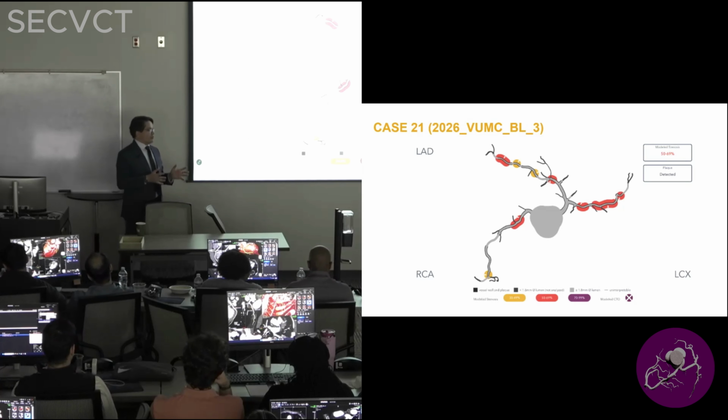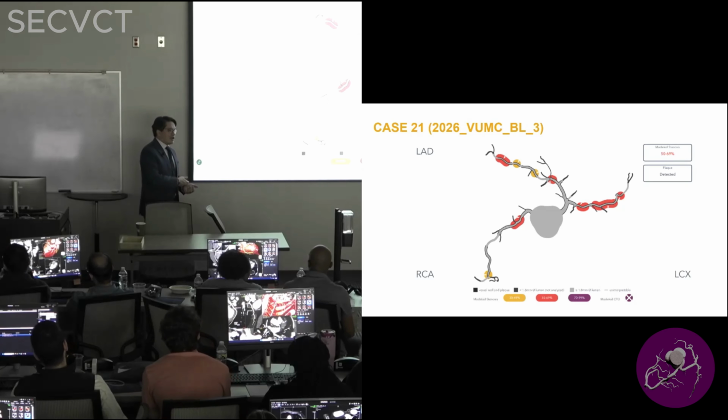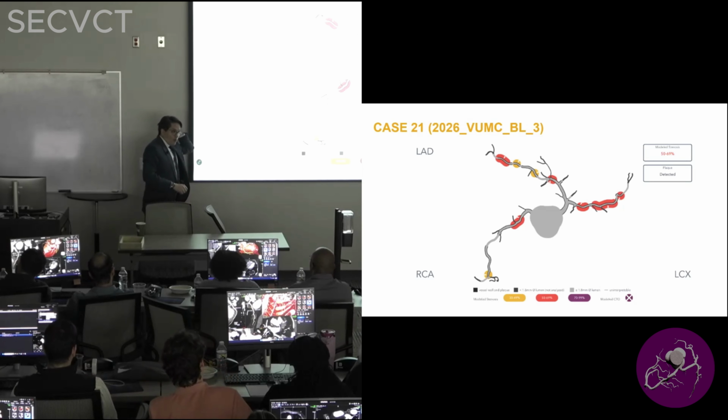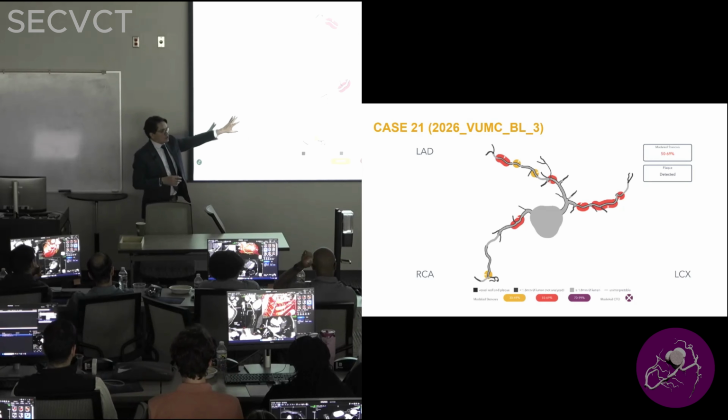What you can do is sometimes, if the patient's pretty stable, you can offer functional testing on top of that, if the patient doesn't want to get a cath. Or sometimes you just go to cath. Or, you can see the roadmap, you're going to get the roadmap for pretty much every patient. So the roadmap will tell you if it's picking up the reconstruction and everything.